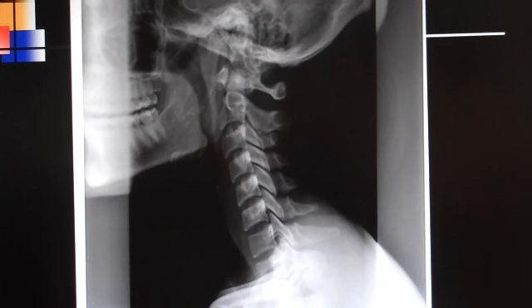And I want to just go through, this happens to be a digital x-ray, but it's very clear and the images are very clear. And so I want to go through the lateral cervical view, just pointing out structures. Now there are several ways that you can read a film. Some people start with soft tissue, then go to the hard tissue, and other people start with the hard tissue and move their way to soft tissue.